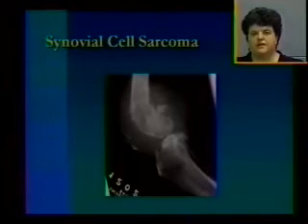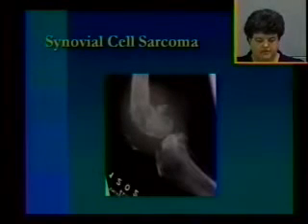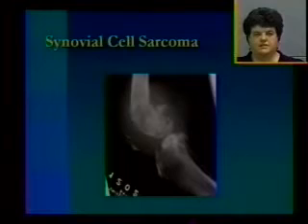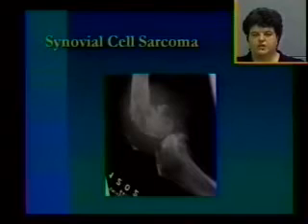There's just a few streaky small areas of mineralization on the cranial margin of the soft tissue swelling. And then the entire distal femur is lucent with variable areas of mineralization. You can also see that there's a square, chewed out portion of the tibial plateau of the proximal tibia. So this, unlike the osteosarcoma we just saw, actually is affecting more than one bone. So you might think that this actually is an infectious process.